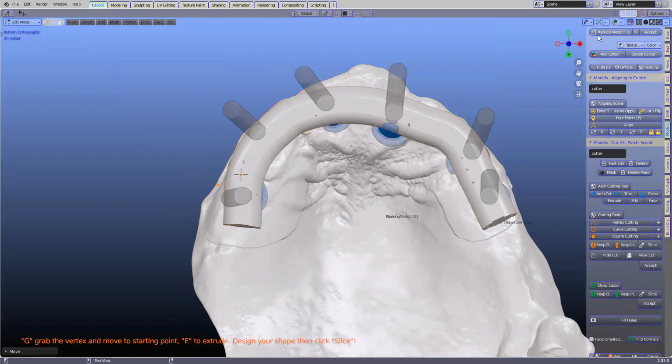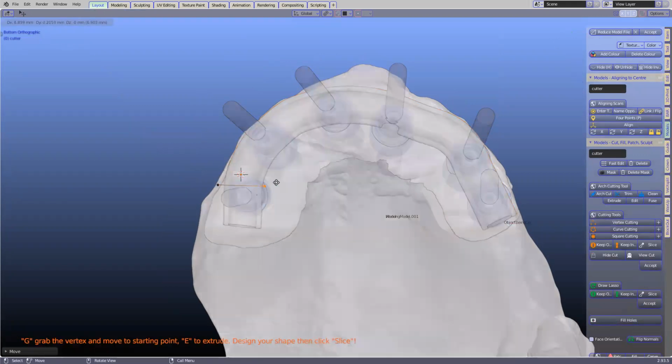and we're going to select transparent. Here, we're going to section this, Shift D, Shift D, and extrude it.